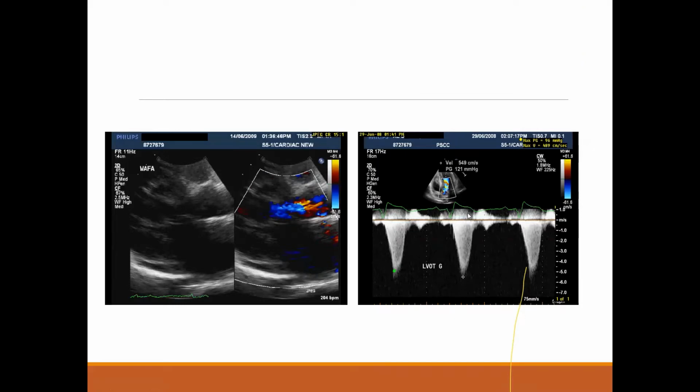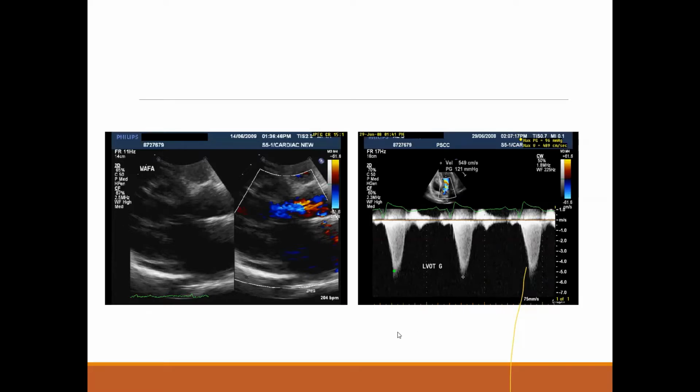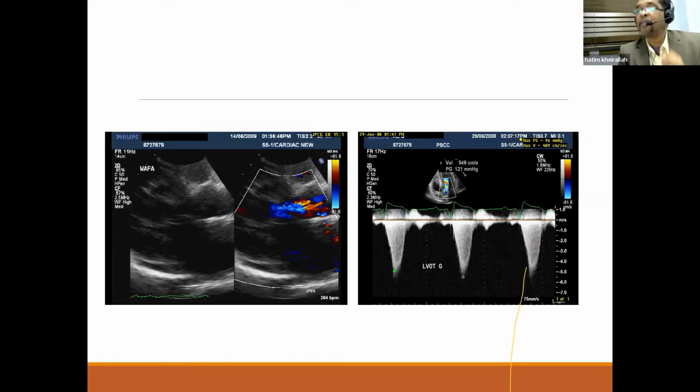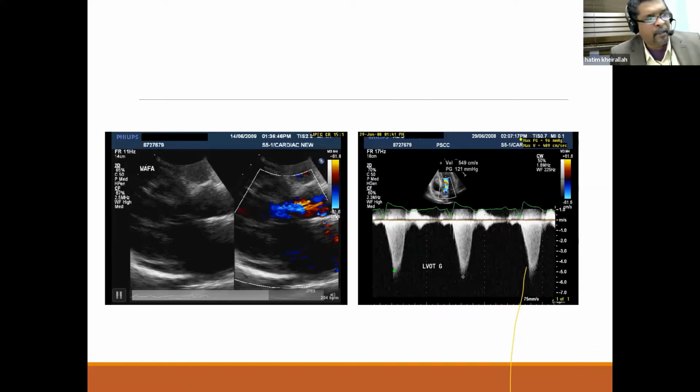Dagger shape, indicating stenosis or LVOT obstruction. Exactly. This is dagger shaped, which is late peaking of velocity. Dagger shape is a descriptive term, but if we have to describe it in echo language, we are going to say that the signal is showing late peaking velocities.